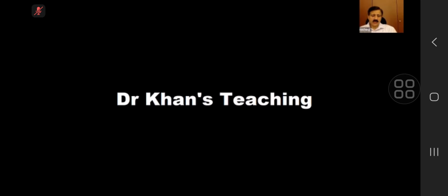Okay, so here we stop. Today, if you see, I have shown you case after case after case. I told you that statistically speaking, CVS is the most commonly asked cases in the exam. And you will see that most of these cases are not difficult. They are just, develop your eyes to pick them up.